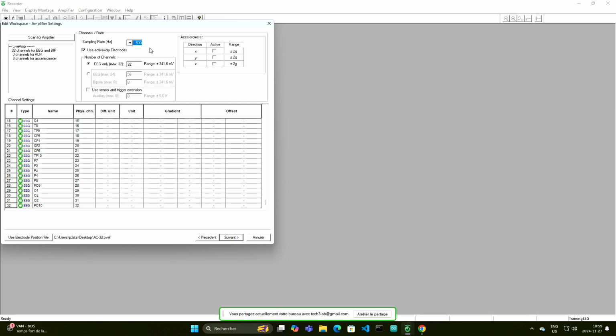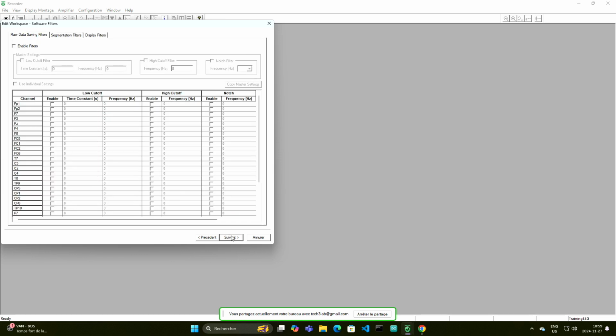So that looks good. And the sampling rate we also want to check. Whoever the scientist is on your study, they're going to tell you what sampling rate they want to use for the experiment. As a general rule, we tend to use 500 Hertz as our sampling rate here in the lab. It's more than what's necessary for EEG, but it does allow a lot of flexibility in your analysis later on. We can go as high as 1000 Hertz, but for the most part, that's not necessary. But again, talk to the lead scientist on your study to find out what the appropriate sampling rate should be for your case. Thanks, Xavier. Let's go to the next screen.